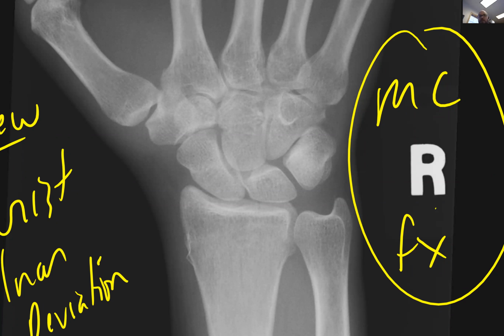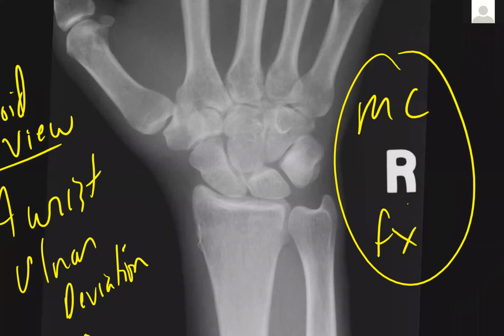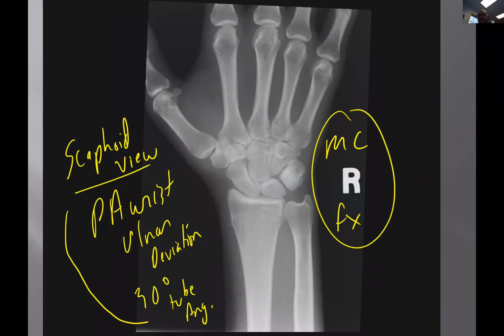Anybody? Bueller? Guys buy that? I buy it. Okay. Thank you. I just want to make sure I'm still with you guys. Very good. So I think it's going to be okay, but because of that lucency, I wanted to get an MRI and see how bad this is.